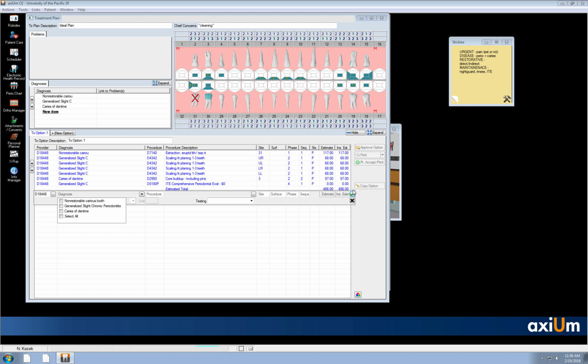We have our number 3 buildup. We see 19 and 20 have occlusal composites. Let's say those can just be redone. So very simple with composite. You put in COMP, and then you kind of see all your options. So in this case, we know 19 occlusal, so we see posterior, 1 surface. And we do 19 occlusal. You know your surfaces, MODBL. Phase 2, part 2. No, at this point, part 3.